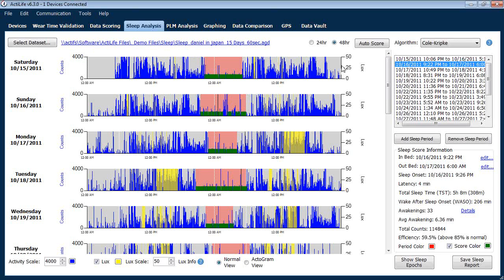This helps to align the sleep periods for people who go to sleep during the night times. As you can see here in the highlighted areas, they're all towards the center. It helps give you an idea of when they're actually going to sleep, if that's shifted or not.